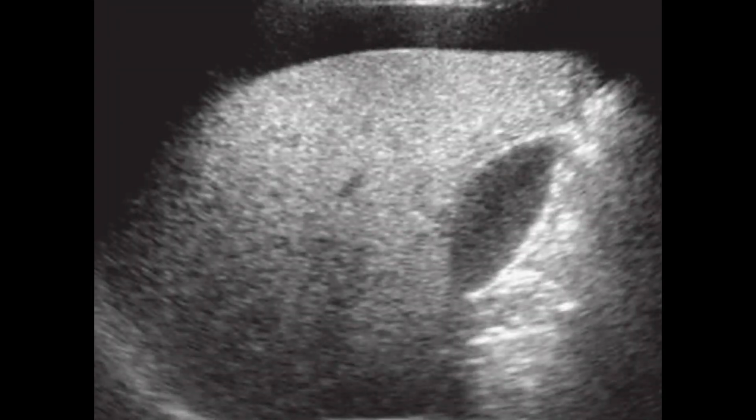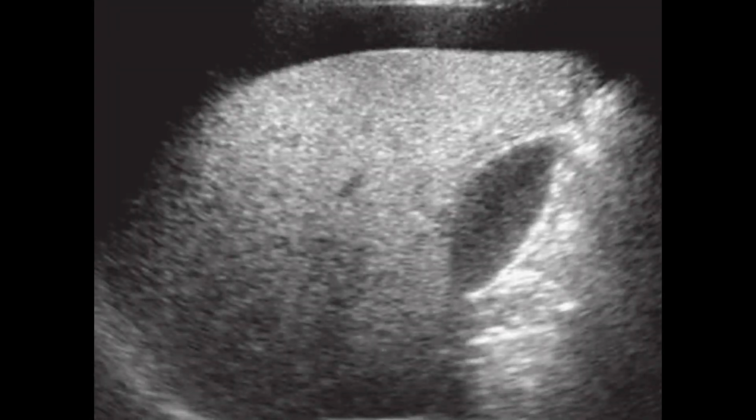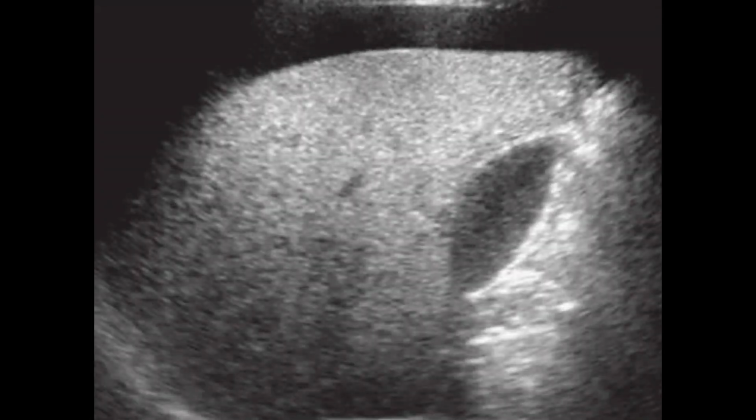Here on this image, you can see that the area surrounding the liver shows fluid accumulation. Besides this, secondary to the fluid, the gallbladder wall also appears thickened. So this is an example of ovarian hyperstimulation syndrome, moderate and severe degree. So whenever you look at the ovaries, always concentrate on the ascites. There will be ascites. Look around the perihepatic area, in the Morrison pouch, and around the kidney area as well.